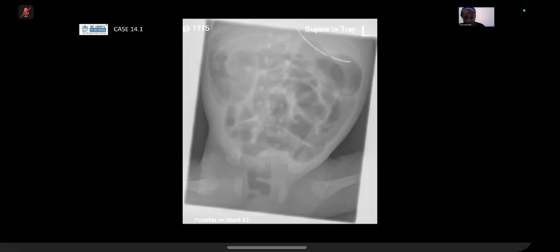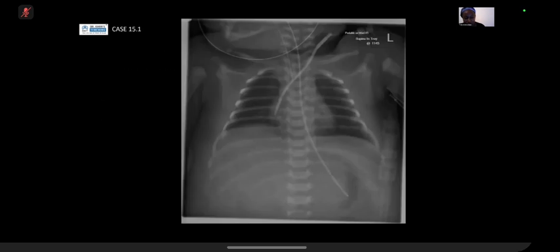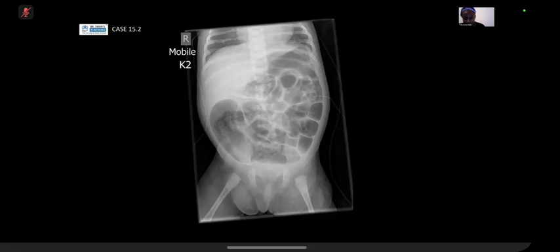I think I did highlight the pneumoperitoneum, so I'm going to skip that question and skip the sign in the previous ones. And I've answered that question about the catheter, and we've done the pyloric stenosis question.